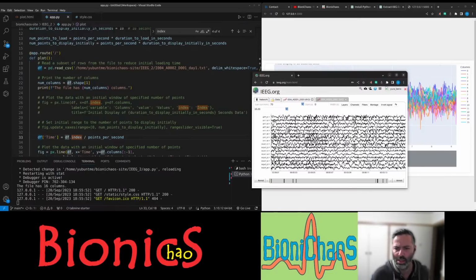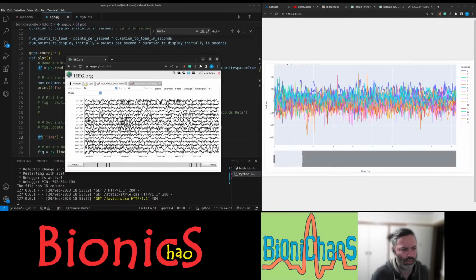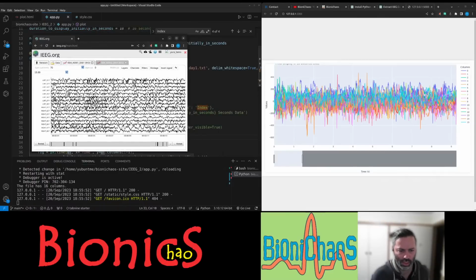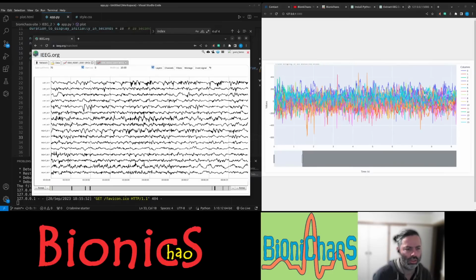Sorry. 04, 02, day 1. That's the file. Let's have it about the same size. Let's display 10 seconds.